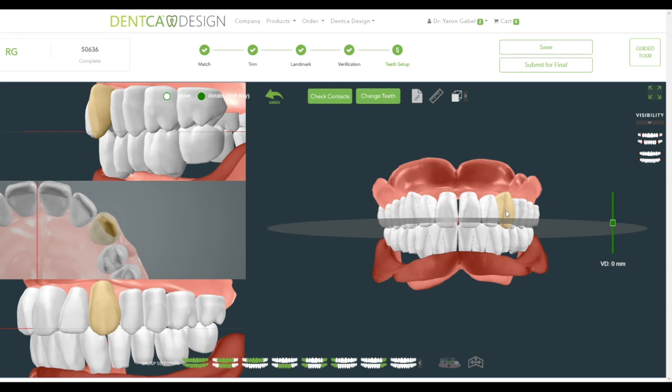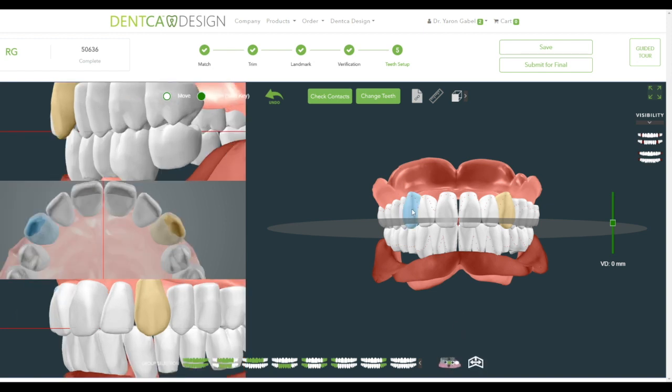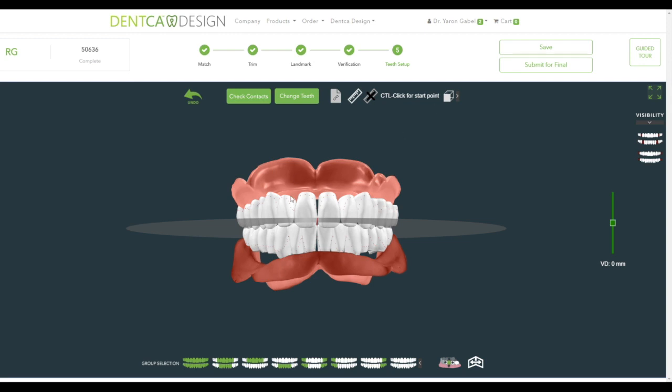If you would like to move teeth in both sides of the arch at the same time, you can use the mirror function to rotate or translate teeth as a set in a specific direction. To move a specific group of teeth, select the group from the bottom part of the menu and move them around as directed before. Also, a ruler function exists to allow you to measure specific aspects of your denture, such as a canine to canine distance or the width or length of a particular tooth. Simply click on the image and then Control and left-click on 2 points to measure them.